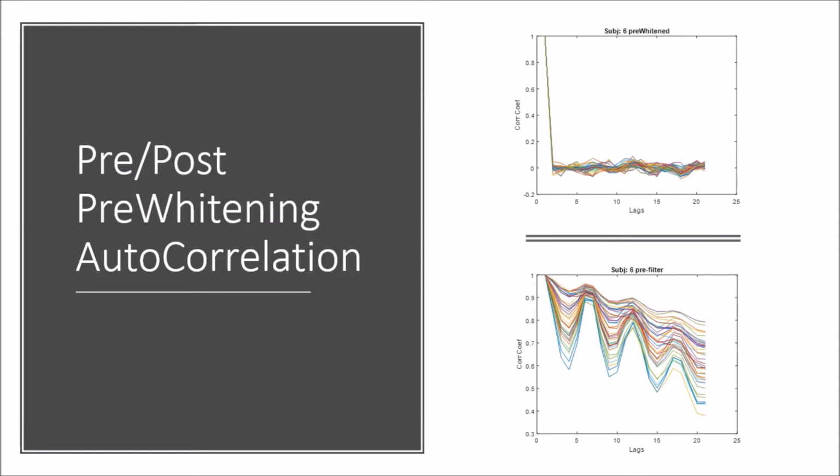In the NIRS Toolbox, you're essentially dealing with similar things. So I have these a little bit backwards, but the bottom filter here is actually untouched. It's the natural correlation matrix, if you will. So what it's showing is time point 0 through time point 21. And time point 0 is going to be 100% correlated with itself.